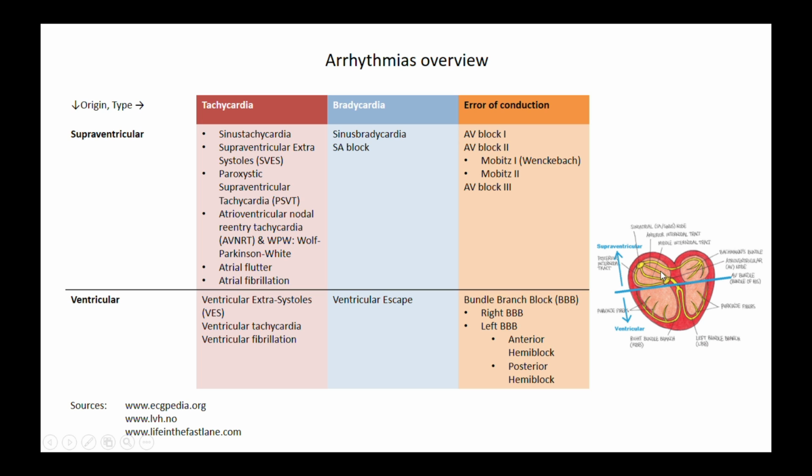Now, what we mean by supraventricular arrhythmias are all arrhythmias occurring above the bundle of His.